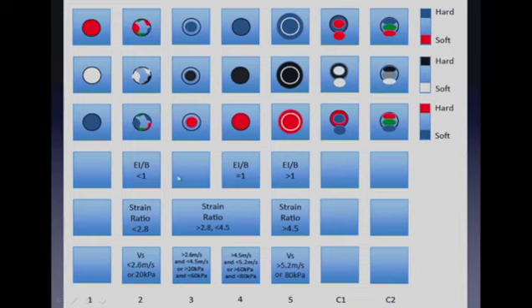If we look at the method that I use, where we're using the EI to B-mode ratio, if the ratio is less than 1 based on our data, I would give that a BI-RADS 2 because less than 2% of these lesions turn out to be malignant. If we have a ratio of equal to 1, I gave that a 4 because some of these lesions are benign, but in our hands, some low-grade cancers such as DCIS or mucinous cancer give us a ratio of 1. And if we use the ratio of greater than 1, I gave that a 5. And again, based on our data, we have a sensitivity of greater than 98% that these are going to be malignant lesions.